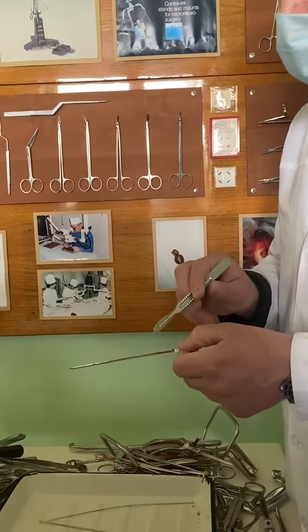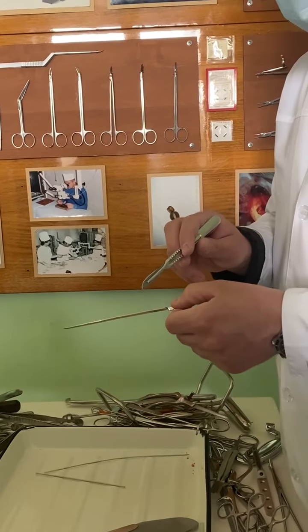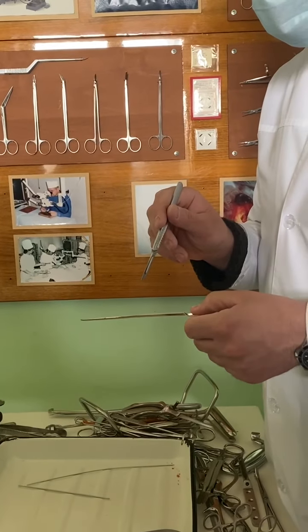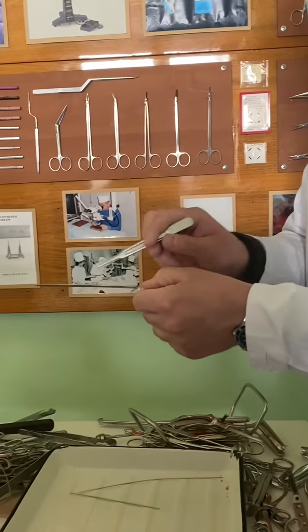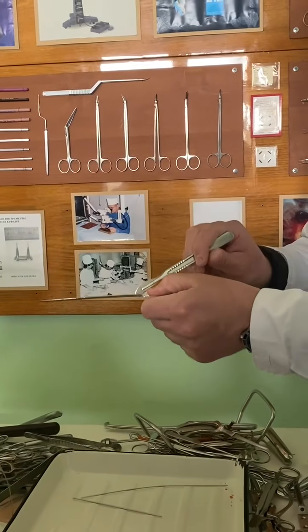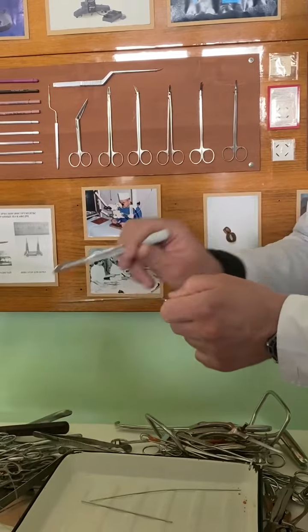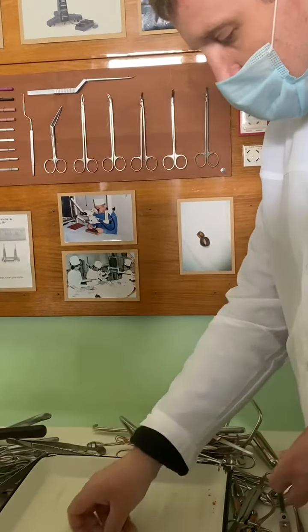We can cut some thin structures like fascia, like peritoneum. We make first a small puncture of the necessary layer. Then we put the groove under this layer, and we see if some vessels or nerves are present. We can separate them, make them free, and then we cut along the groove. Blade looking up. Groove probe. That's all. This instrument is for next semester.